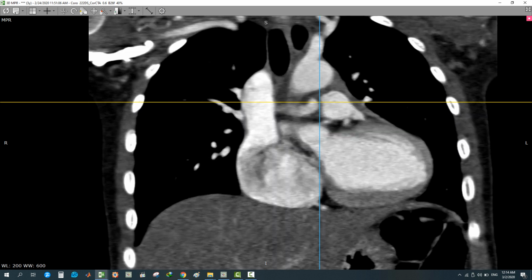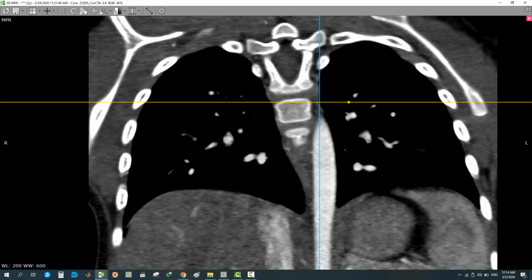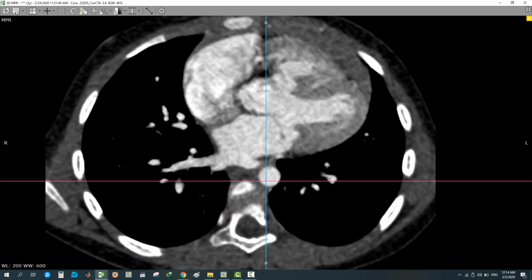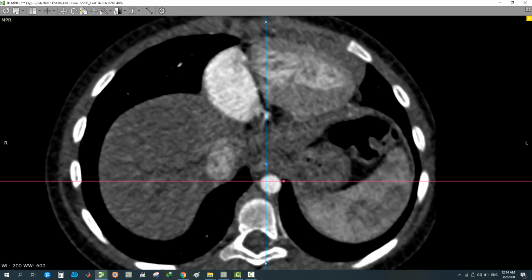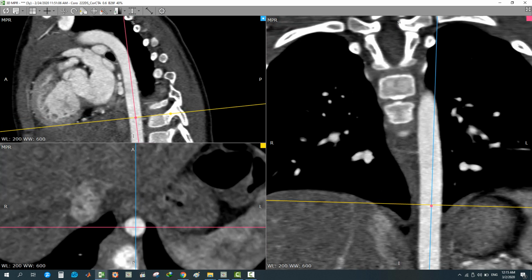Okay, then after that, you will need to measure the aorta at the diaphragm in this way. In the axial, go to the axial. Okay, scroll downward, after the esophagus joins the stomach, like this here. Okay, this is the esophagus, this is the aorta at the diaphragm level. Just tilt with the obliquity of the vascular structure, this one, and measure the aorta in this fashion.